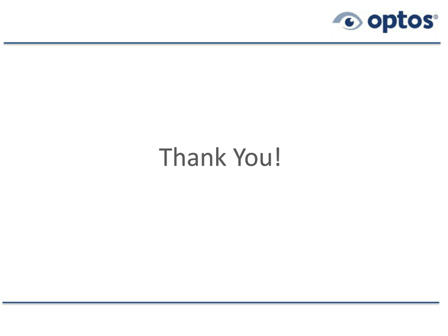The other issue is important. If somebody has a lot of yellow macula lutea, and that's due to the presence of lutein, zeaxanthin, and mesozeaxanthin, the yellow carotenoids are absorbing the blue light. If you're using 488, the blue light, a lot of patients who have a lot of carotenoids will wind up with dark maculas because a lot of the blue is being absorbed by the carotenoids. I've overdiagnosed maculopathies in patients with 488.